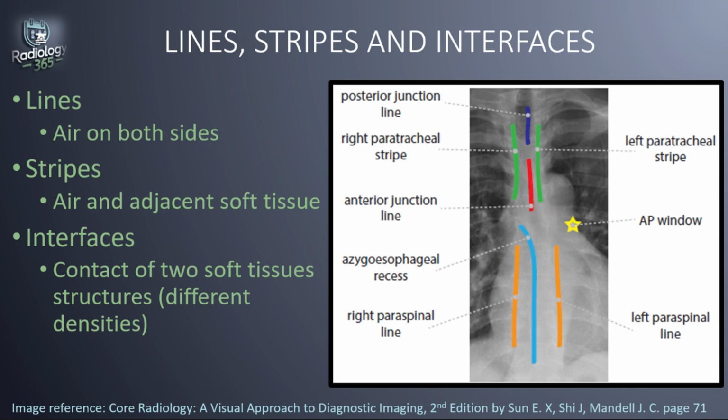When you have abnormal thickening of the right paratracheal stripe, it's most commonly due to a paratracheal mass, including adenopathy or thyroid or tracheal neoplasm. Thickening of the left paratracheal stripe also has similar differentials. A mediastinal hematoma should also be considered in the setting of trauma.